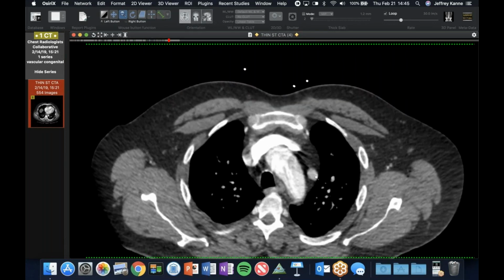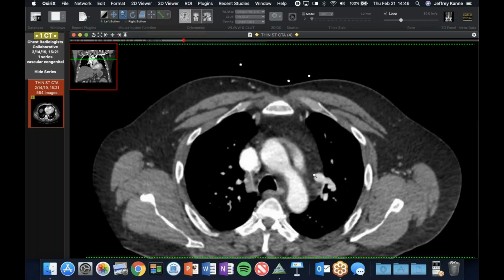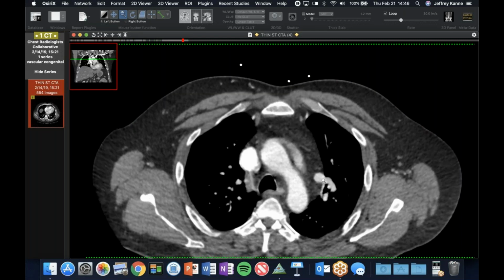And I always tell the residents I have a rule: there's no vertical vessels allowed lateral to the aortic arch, and this is why. It's either an SVC or anomalous venous drainage. In this case, it's anomalous venous drainage, the left upper lobe. But the reason I'm showing it is, to me, there's one vein coming into this vertical vein at this location, which is what we typically see.